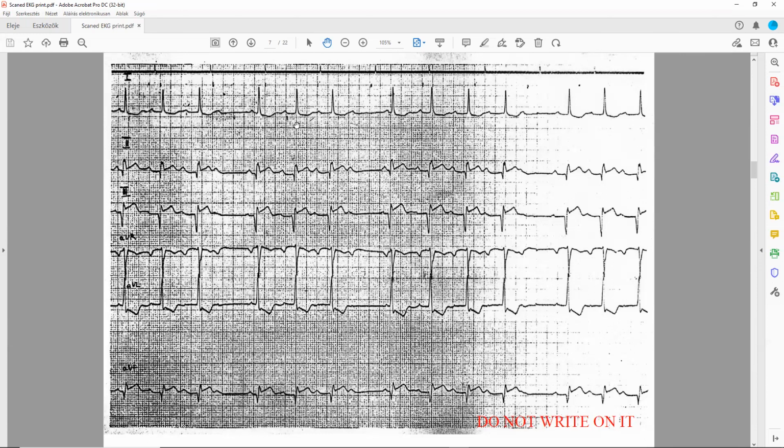That's equiphasic. You have to look at least at the 6 leads to see whether there is, okay, now, so 6 leads, and you do see that this is equiphasic. So what does it mean if lead aVF is equiphasic? It's 0. The axis is around 0. All right, good.